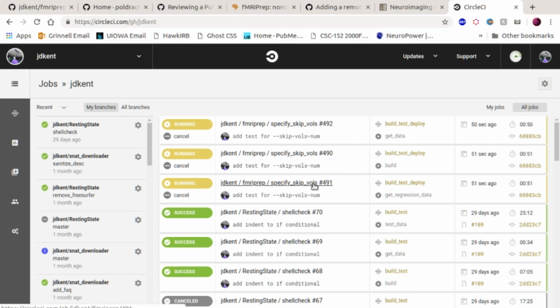But I don't think I'm gonna wait too long for these tests to finish. I'm just gonna call it quits for now, and I hope this video demonstrated at least some of the things that one would do to contribute to FMRIPREP, and I hope it's helpful. And I hope that people can have feedback for me to help improve my own workflow. So with that, I'll say goodbye and good night.